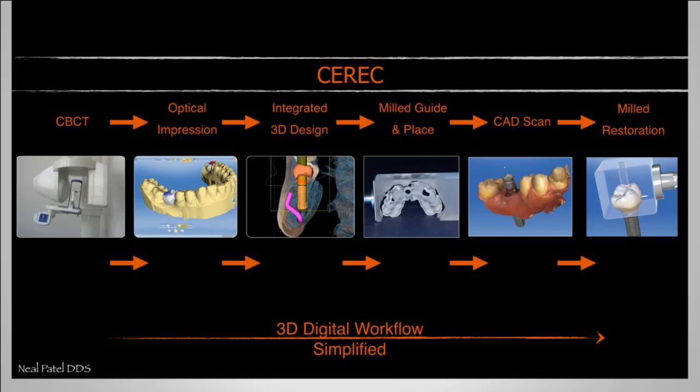Once the implant has been designed, we have the ability to send the data back to our CAD/CAM machine, and there's an opportunity for us to also mill the surgical guide. The milled surgical guide is something that CEREC can do. It does require the 4.4 software, but with a milled surgical guide, we can actually perform guided osteotomies within one appointment. And once the osteotomies are provided, we can place our implant, and we can then utilize CAD/CAM technology to rescan the placement of our implant, design prosthetics, and mill our restorations.